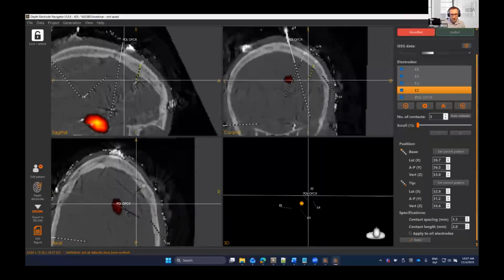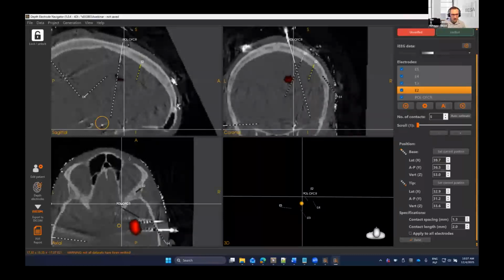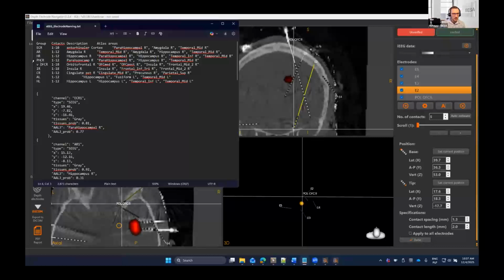Oh, and it might be that I actually did not correctly say the naming. I told you that this is a tricky part, especially for me. So we know that it was the frontal. We have here the frontal. So this one will be the shorter one.